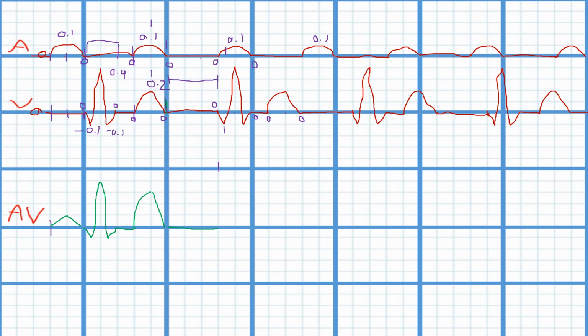Well, if I made $1 but I lost 50 cents, I got 50 cents to the good. If I made 50 cents but lost $1, I got 50 cents in the hole. And that's exactly right here. So we're going to go down half of a little box. So we've gone down half of a little box right here. Now, we're going to look at the next. We're just going over half of a little box right here.